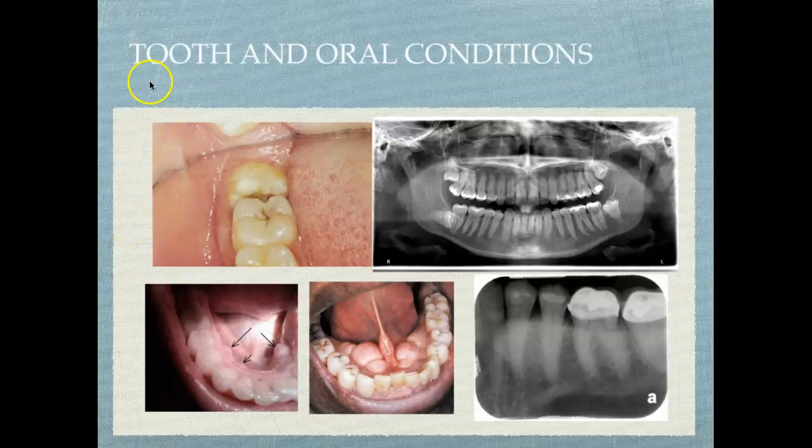Some other tooth conditions, so clinically we see an impacted molar, and our panoramic image is a good image to actually see impacted third molars. Again, the diagnosis is for the dentist and the hygienist, but we would be able to verify that we have a diagnostic quality image by being able to identify all third molars here on this panoramic.